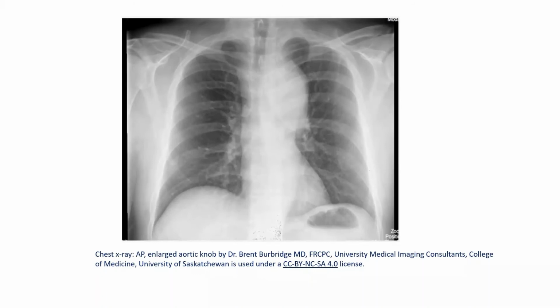Now, for me as a cardiologist and for you as a cardiologist, the most feared diagnosis, if you see this chest X-ray, is what? Aortic dissection. Very good, aortic dissection. So if you see this chest X-ray without seeing a patient, will you say this is dissection? No, but you are going to give dissection as one of the differential diagnoses.